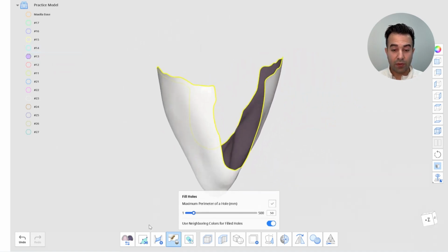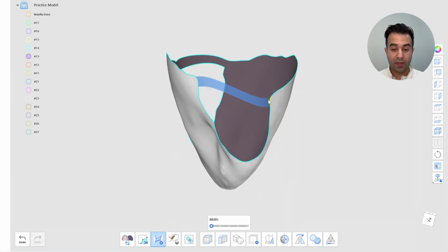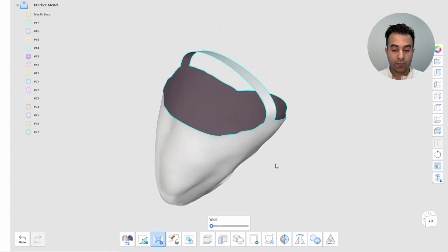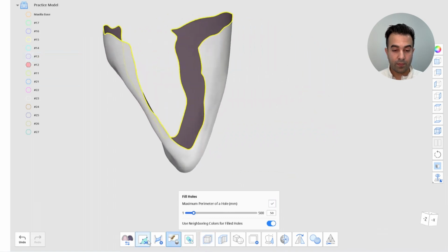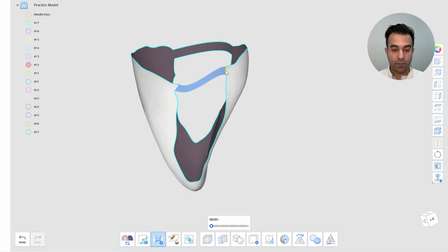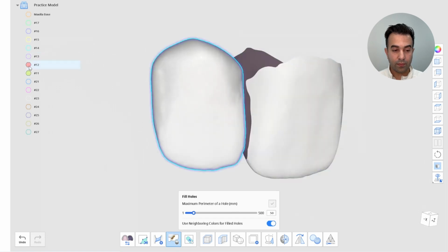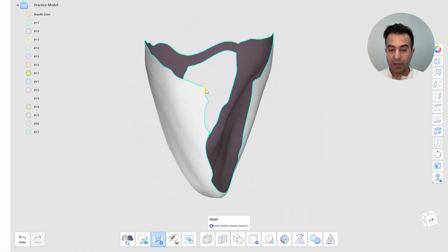And I'll show you how I'll be able to use them for future projects by simply drag and drop or click the import button in the Medit Design app. We are at halfway through.